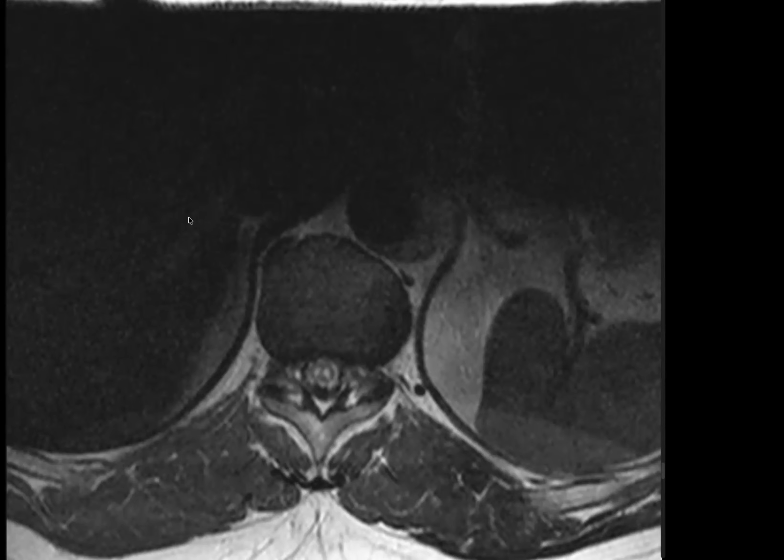Okay, so do you think this fits the picture, given the clinical information and the finding? Do you think this is compatible with the diagnosis that you have? No, sir. Is there any other sequence that might help you decide?